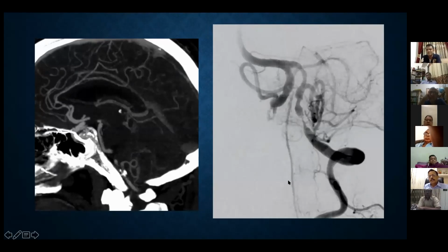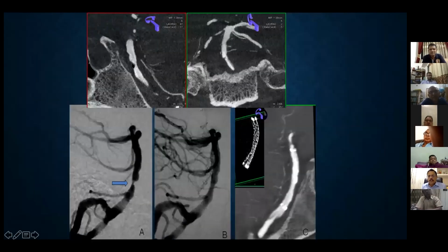And here you can see the anterior spinal artery as well. As I mentioned, these images also help us to study the perforators, the vaso-CT. In vaso-CT we do an intra-arterial injection of dye and get a CT scan-like image, but these are 0.1 millimeter in resolution as compared to around 0.5 millimeter with regular CT angiogram. These are obtained in the DSA lab, and we can study each and every perforator very well. And we will do this kind of imaging, even like this basilar stenosis after stenting, to study the perforators and the stent placement as well.